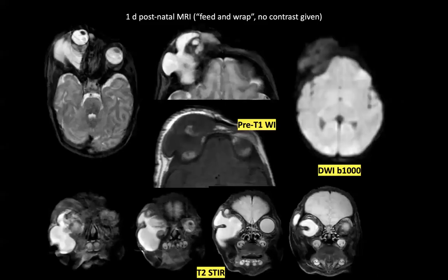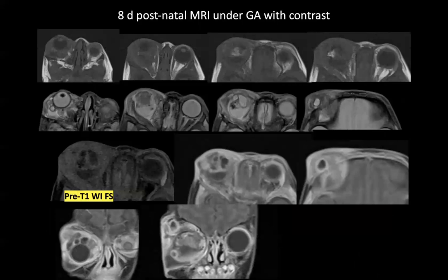Still, we were not sure. And then at Great Ormond Street, we did a post-contrast scan. The mass shows, again, a solid area of T1 hyperintensity and T2 hypointensity. What is this? Is it blood, so typical of a lymphatic malformation, or fat that will push the diagnosis somewhere else? So I repeated a scan, and surprisingly, the mass was less cystic, more solid, and I did ad hoc, as an optional sequence, a pre-T1 with fat saturation that showed that this was not blood, it was actually fat.